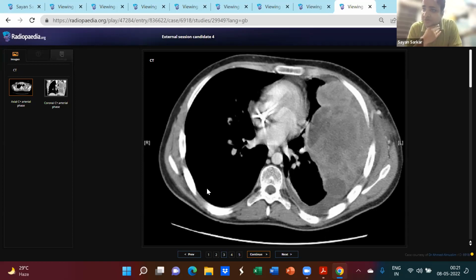So when you are sampling a lesion like this, what are you looking for? What are the things that you're looking for when you're sampling? Which area you're targeting basically? A solid area. How will you assess that on an ultrasound? On ultrasound, a fluid area would be more heterogeneous. No, I mean, see, there is no fluid area in this lesion, right? So everything is almost like a solid thing only.